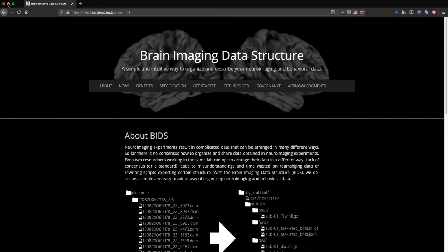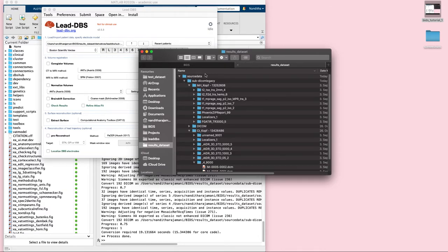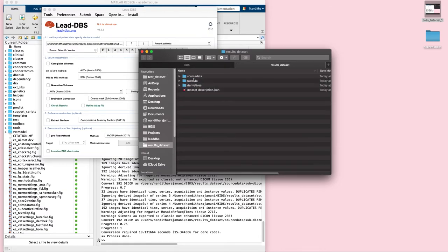The main structure which is proposed by BIDS is the presence of these three datasets, which is the source data, the raw data, and the derivatives folder, and the presence of a dataset_description.json, which, as the name suggests, is a JSON file describing the dataset. Now let's go through each of these folders in more detail.